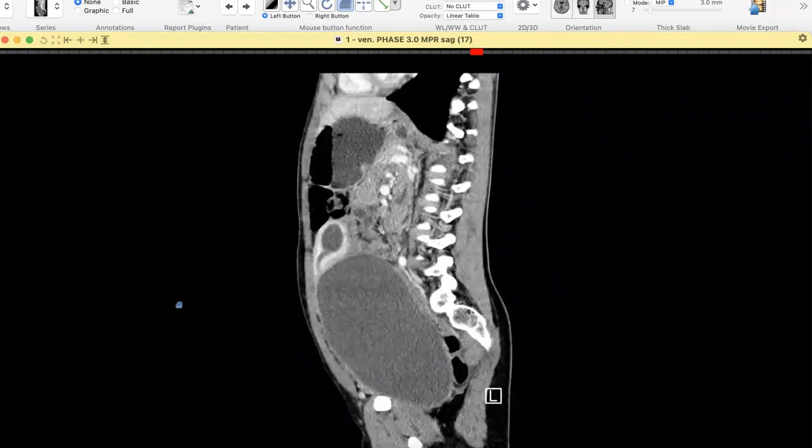Yeah, there is a huge cystic lesion. I can't see the uterus or any structure in the uterus. So I think this is one of the Müllerian deformities or abnormalities. It could be aplasia. It could be hematometra. So if it's a Müllerian abnormality and the uterus is not formed, where is the blood coming from?